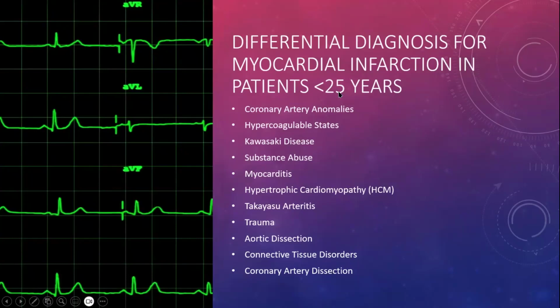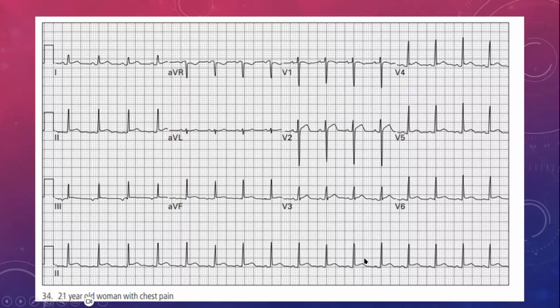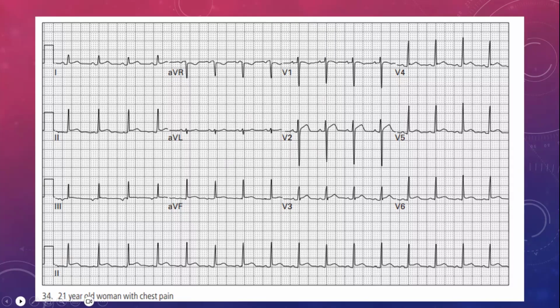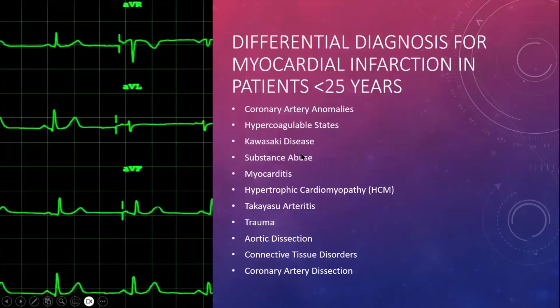Now, this is in patients where your enzymes come back as elevated, all right? But in this patient here, there's one particular thing that makes me think that it's not a myocardial infarct, okay? And this is something that you need to remember whenever you are looking at these, because all of these other diagnoses that are here, while they do occur, are not actually that common.